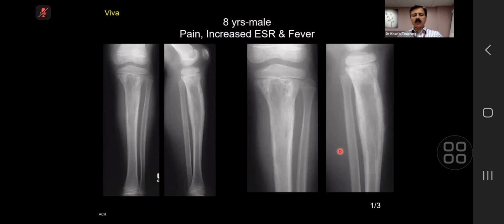Aggressive lesion, and I'm concerned with the fever about osteomyelitis, Brodie's abscess, septic process. I would call it an MR. Okay, I don't have an MR, but I just want to ask you differential. So you have talked about aggressive process, absolutely fine. Infection, absolutely fine. What else?